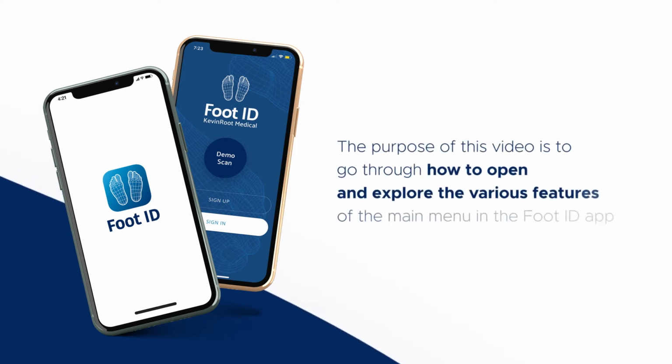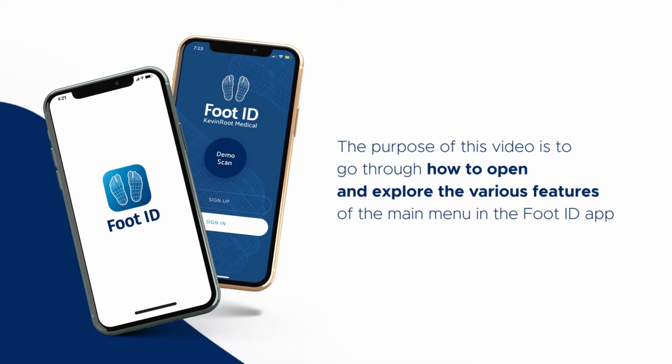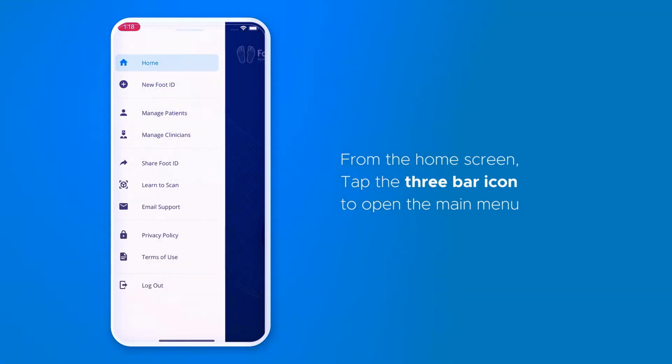The purpose of this video is to go through how to open and explore the various features of the main menu in the Foot ID app. From the home screen of the Foot ID app, tap the 3-bar icon on the top right of the screen to open the main menu.